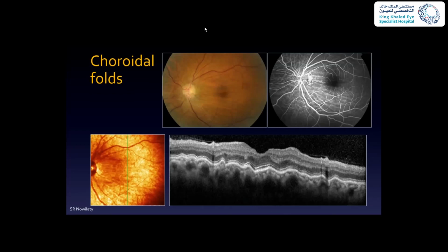Okay, well, I'm glad that you said that. The reason why it's not drusen is because you cannot see the Bruch's membrane, can you? Okay, and I understand why you say that, but if you follow, you'll see that the choroid itself follows this up and down appearance, right? The choroid seems to follow the RPE. The choroid doesn't stop here, and then you have a thin line that is a drusen.